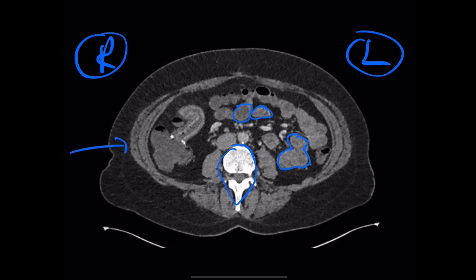The abnormality is here in the right colon. So we know that this patient has had a resection, because we can see those clips? White suture material. Suture material. Okay. And we can see the little bit of bowel coming into the colon here. So the suture material delineates the anastomosis. Absolutely. And it looks like that.